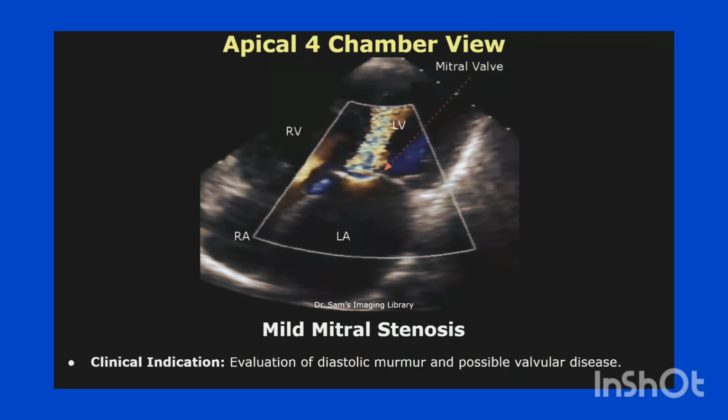This is a report for mild mitral stenosis. Clinical indication is evaluation of diastolic murmur and possible valvular disease.